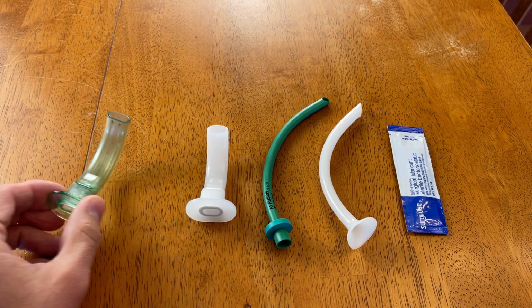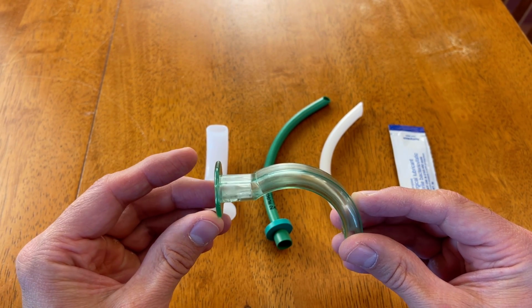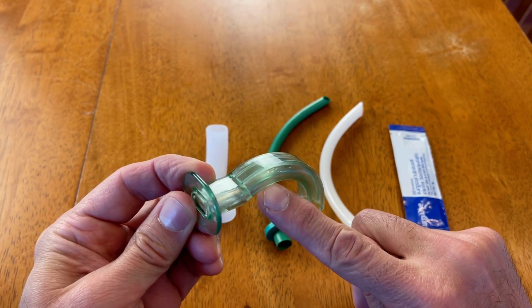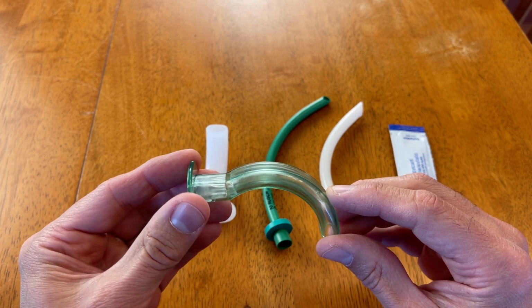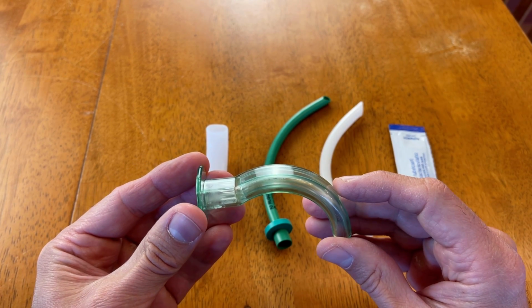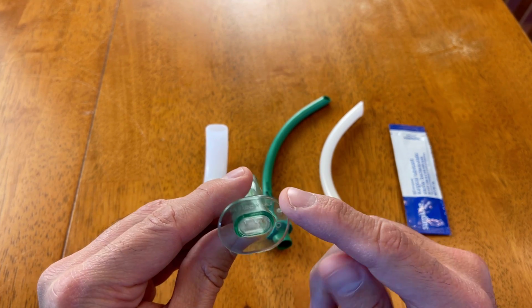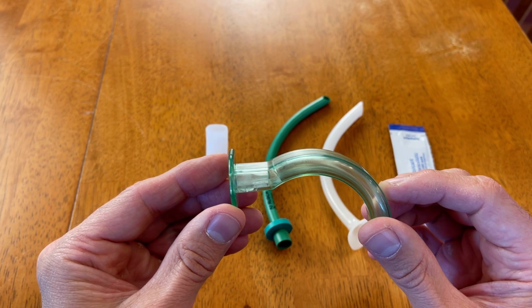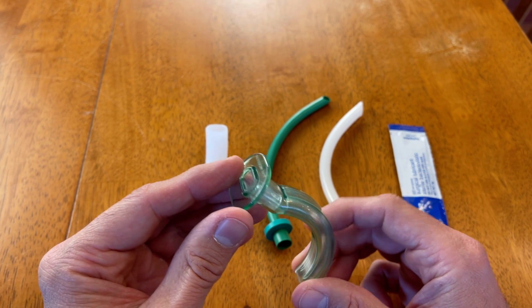But as you look at the oropharyngeal airway, the anatomy of it, you can tell just by the contour of it how it's designed to fit over the soft tissue in the tongue and displace that tongue forward from the posterior pharyngeal wall and improve airway patency. The anatomy on this one, as you look, this outer portion here is called the flange, and it rests against the lips or teeth and just prevents it from, once again, migrating further into the airway.